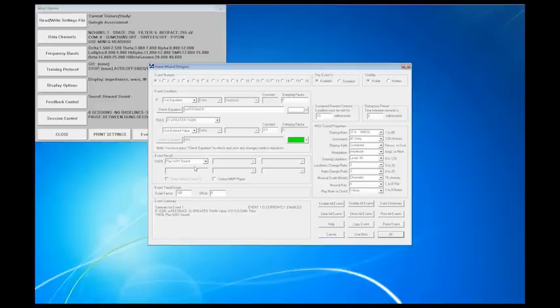So, what we have done in this file right here is we are now calling feedback from the SessionWizard file. And we are now saying when feedback is greater than 0, or when feedback equals 1, I want you to do something. So that's exactly what this is going to do right here. It's easy for me to tell you that's what it's going to do. Let's see it in action.